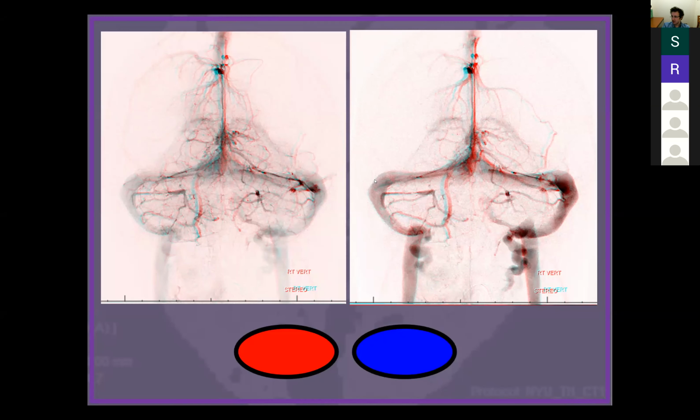The more you look, the more you're going to see them. And like sinuses, they're flat, right? They're located in between the two layers of the dura. And so they have this flat appearance, like a line when you look at them edge on. The same as this petrosal sinus might look, right? That's the same thing. You're looking at the edge of that. And then, of course, you have the jugular veins.